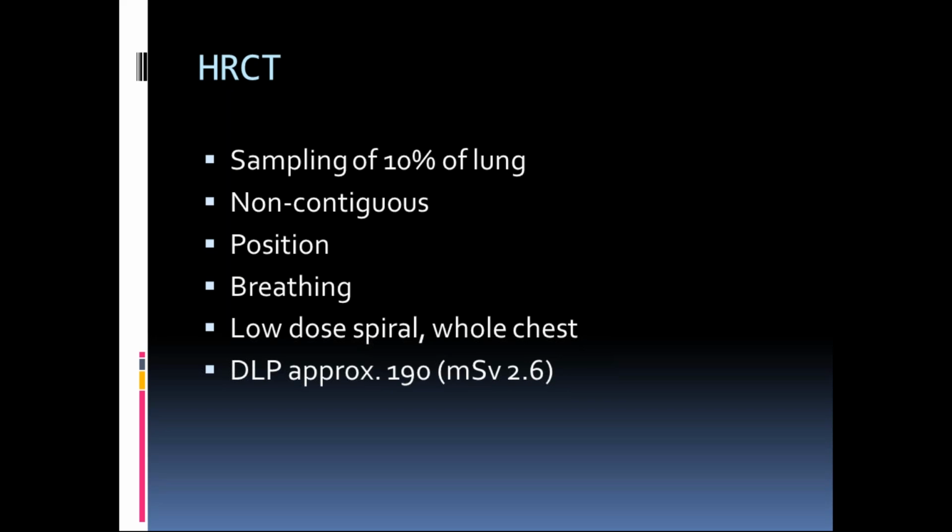Breathing is difficult for patients because they're already coming in with difficulty breathing, so you do the best you can. We try to have them breathe consistently through the entire exam, holding their breath in the same position, and they usually do a pretty decent job.